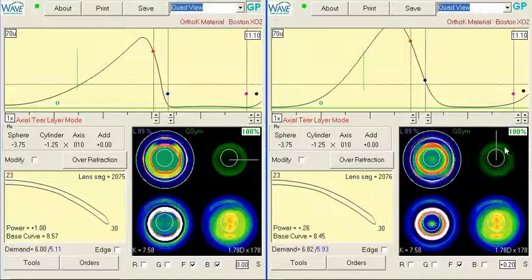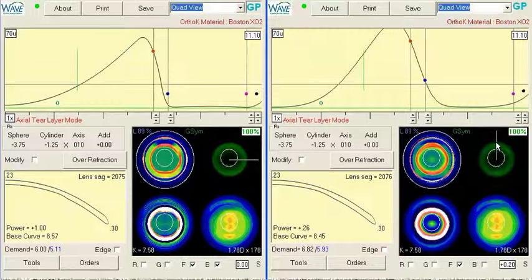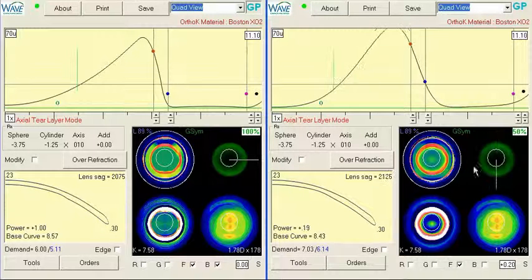discrepancy in demand in the vertical versus the horizontal. So I think we had about a diopter and a half. If we're at 63 here, then we want about 70, plus 77, I guess, or plus 87. So in 50%, too much. Okay, and then we have to do the same thing down below since we're in freeform.